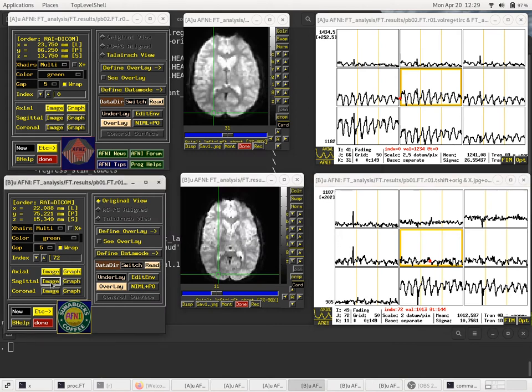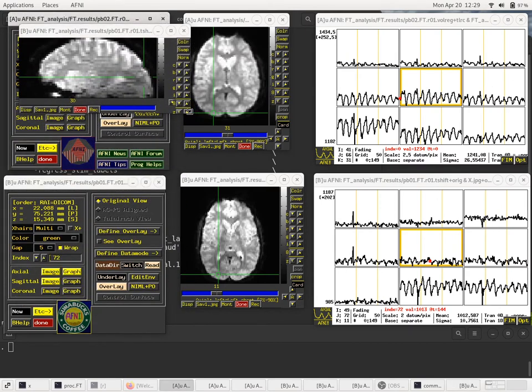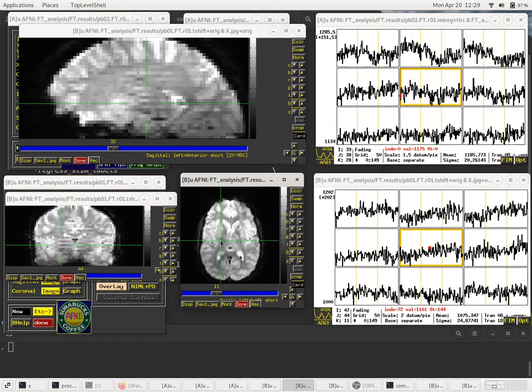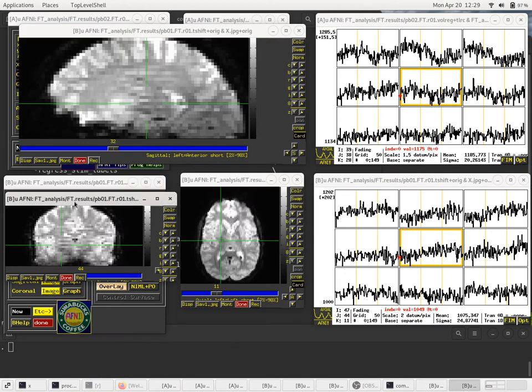And let's look at particularly the sagittal view. I'll throw that up here and make it a little bit bigger, and we can toss in our coronal image as well. So let's go a little bit more randomly in the center of the brain, so not mid-sagittal but kind of in the center-ish, so we can see all 3 views pretty well. And we'll go to time point 0, volume 1, the first volume in the control window, and pull back up the coronal image.